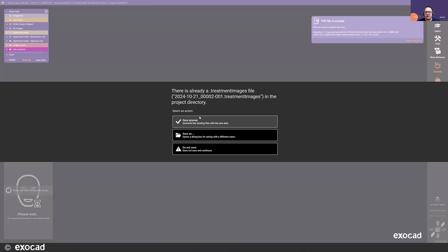And with this one, I did have a treatment already planned, and this is a good thing to show to where with our software, you have the ability to create scene files. So you could design this case with different tooth libraries, for instance, to show the patient multiple PDFs.